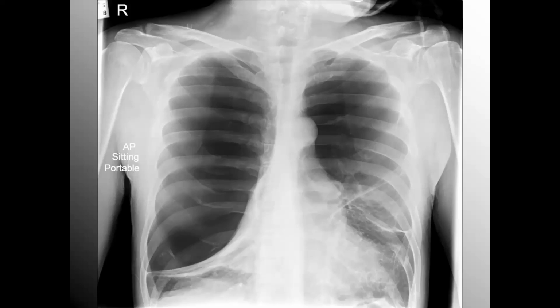It describes giant bullae in one or both upper lobes occupying at least a third of the hemithorax. And of course, it compresses the surrounding parenchyma. Traditional risk factors are always going to be the same: tobacco smoking, marijuana use, or good old-fashioned alpha-1 antitrypsin deficiency. This is a younger person, by the way. Vanishing lung typically occurs in young, thin male smokers, and it's very progressive. Its etiology is unknown beyond maybe a genetic predisposition.